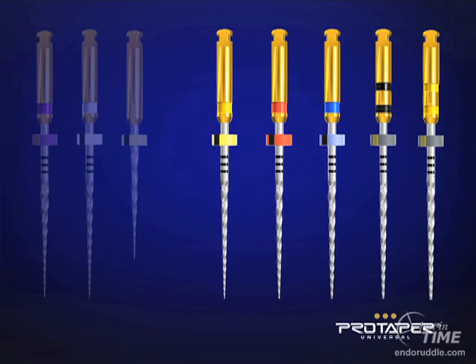And to go on quickly, the red one is a 2508, the 3009 is the blue handled file, and the two black stripes are suggesting it's a 4006, and finally the two yellow stripes on the handle means it's a 5005. So you have a variety of different finishers to address a myriad of different anatomical configurations.